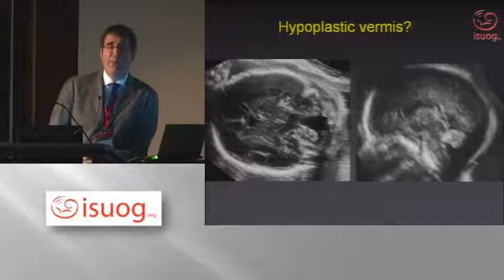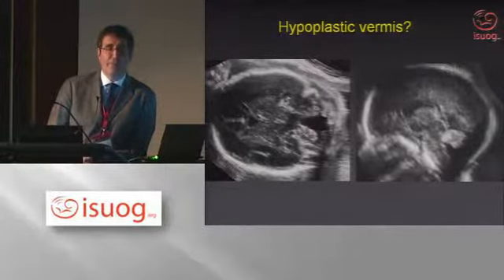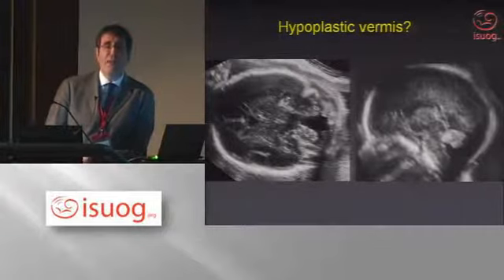Who believes it is hypoplastic? Raise your hand. Who believes it is intact?